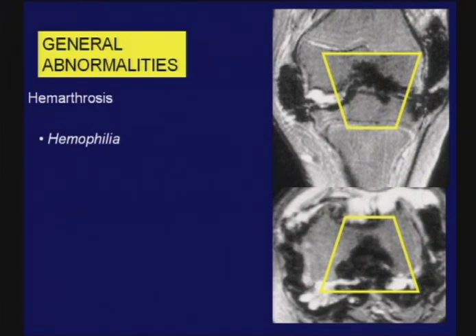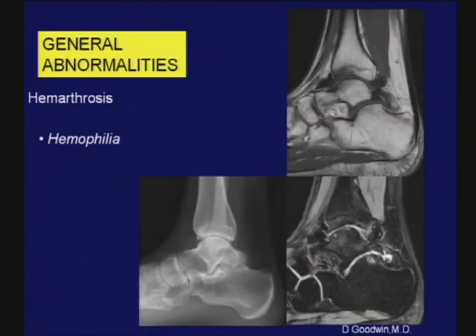It's of interest when you look at the knees in patients with hemophilia who have extensive hemosiderin deposition, as shown here. One of the sites that is preferred for that deposition is the intercondylar notch. Now that's interesting because on a plain film we look for widening of the intercondylar notch as a feature of hemophilia. Here is the MR imaging correlate of that radiographic finding.